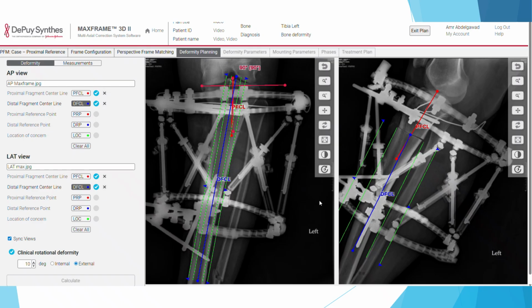All right, now let's go to the point that we want to discuss. So we said, okay, this is going to give you a line like no angle, but there is translation. If you pick the lines here on the concave side, it's not going to work. So what is the best option? The best option is to do it at the level here of the deformity. And don't stick to the idea of the osteotomy, and I'm going to show you in the next part what this is. This is called osteotomy level rule 2.